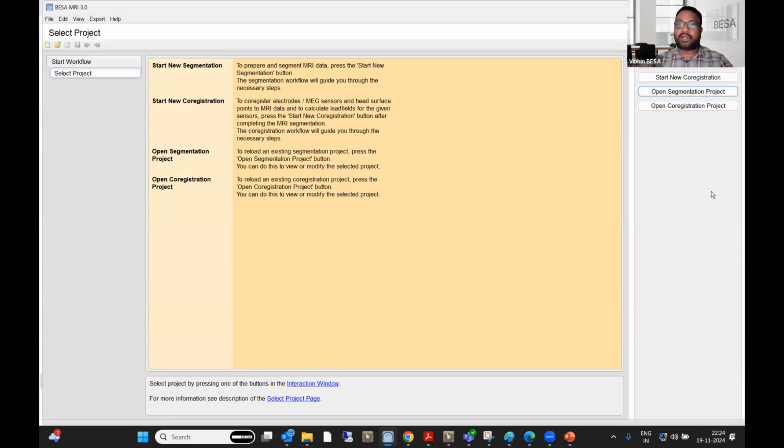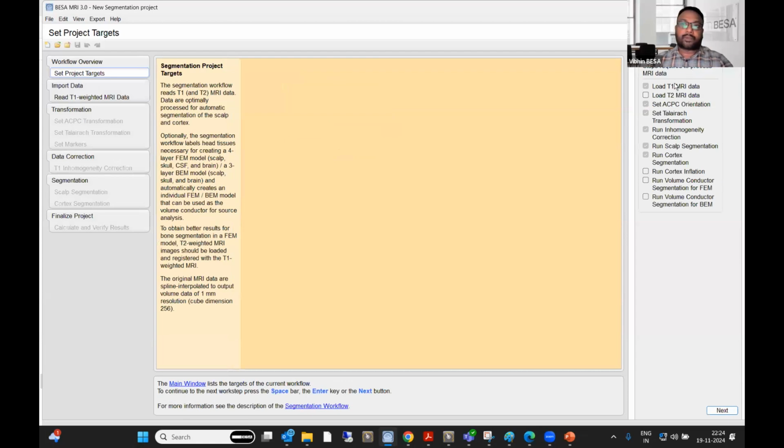So here we go. Let us start new segmentation. And we just continue with the next. Here we can continue with the FEM or BEM, but we don't do that as of now, just to save time.